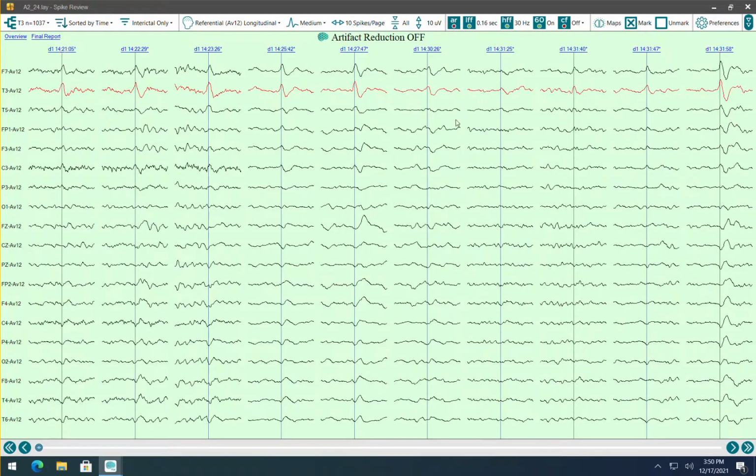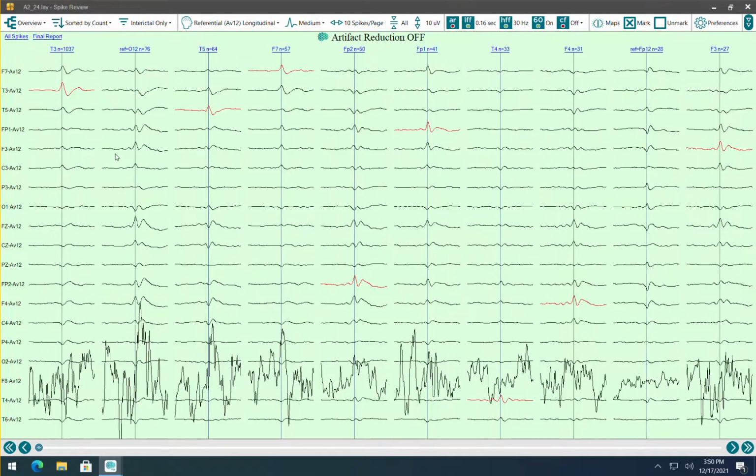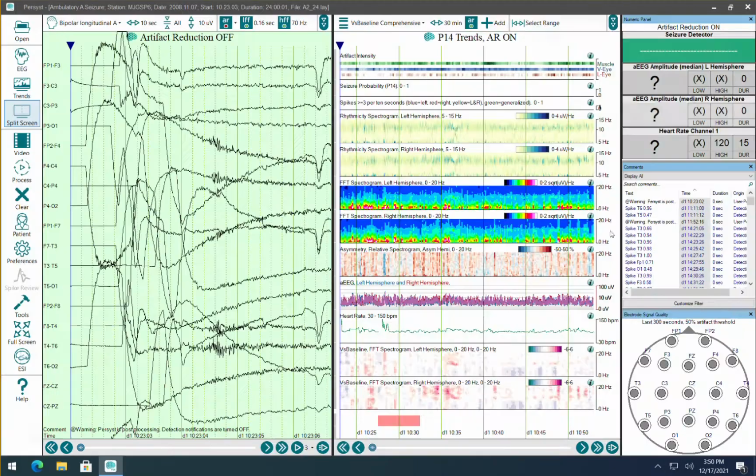And then when I go into this window, we see these 1 second windows again, no longer looking at averages. These averages for spikes are shorter in duration than what you typically use for back averaging as it applies to myoclonic jerks. And I'll show how to create a display that has a longer window duration.